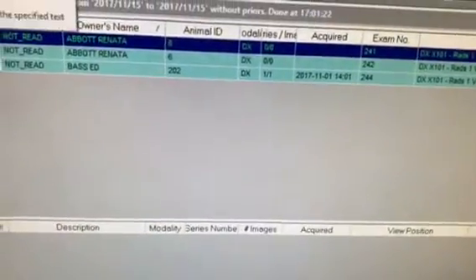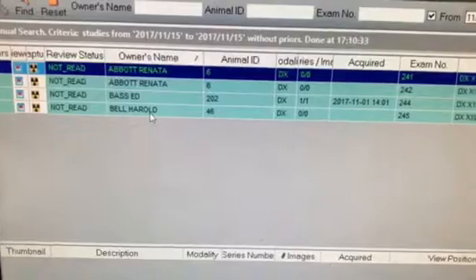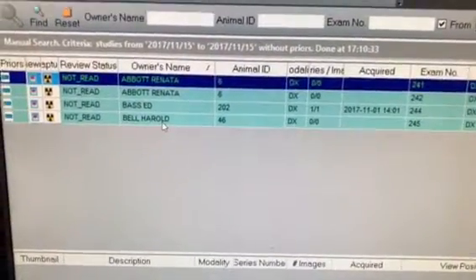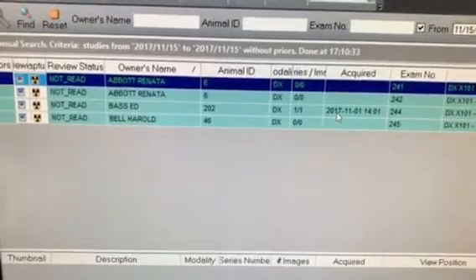To show you this, I'm going to go down and open up the ClienTrax PACS. And I'm going to find the order from today. And in this case, you'll see the order for Harold Bell. At this point, you will not see an acquired date and time.